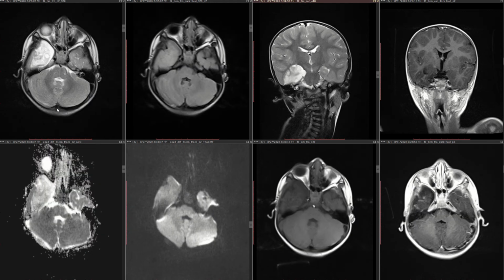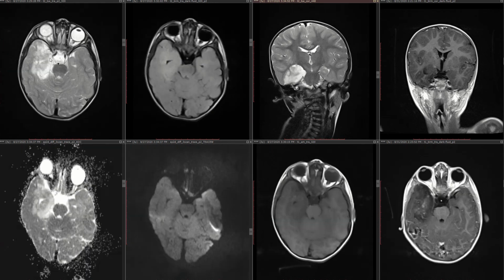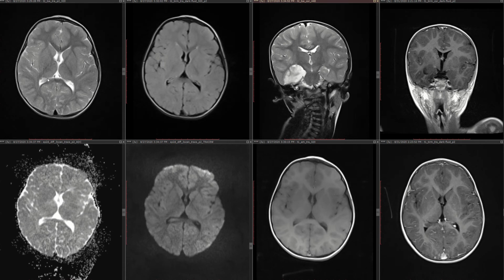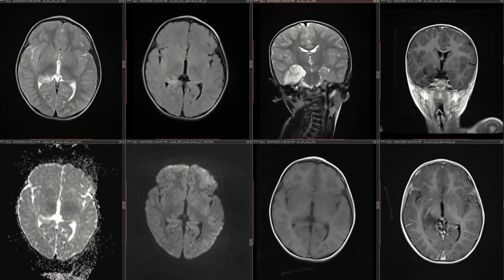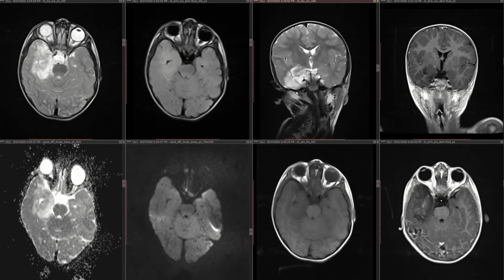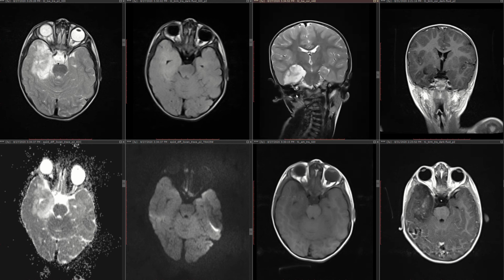So what we have here is basically a right side temporal lobe which is involved predominantly medially, and then when you go up, the hippocampus is involved. It's basically all the limbic pathway until the hippocampus. After that it doesn't follow the Papez circuit, perhaps.